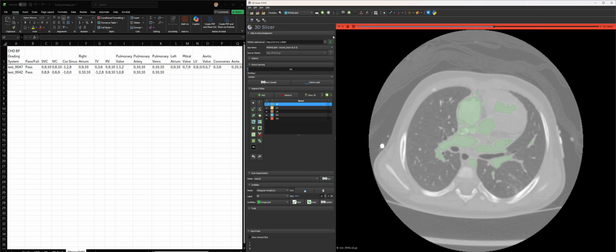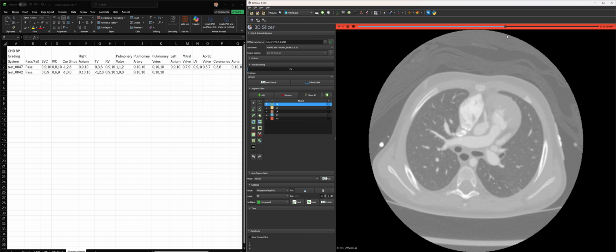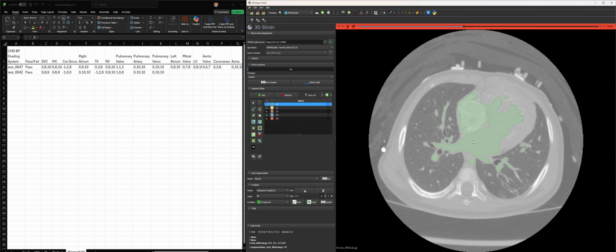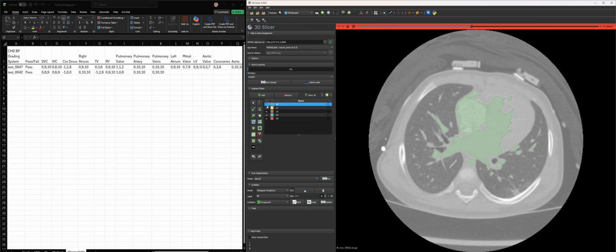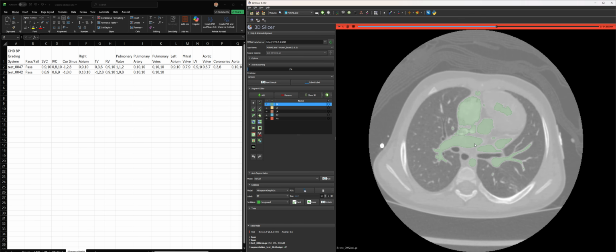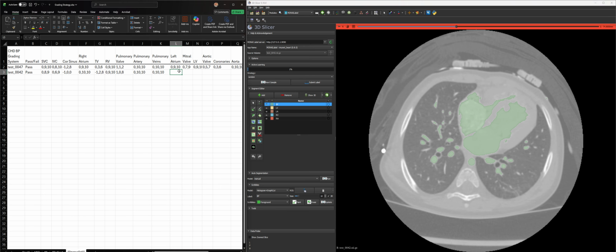So again, the atrial appendage is one of the major components of where it sort of portends how it performed on the rest of the heart here. Here's an example. I don't know if there's an ASD or not, but that's what we can't tell. So that's why I maybe see how there's a negative contrast, or maybe an actual ASD in these. The congenitals, there's so much more that can be possible. That left atrium's pretty, well, what do you think?